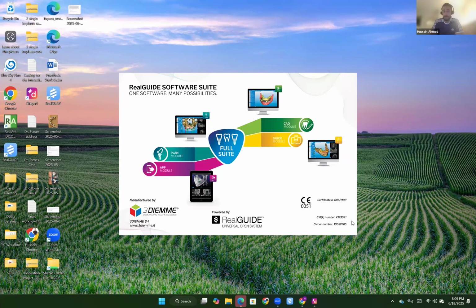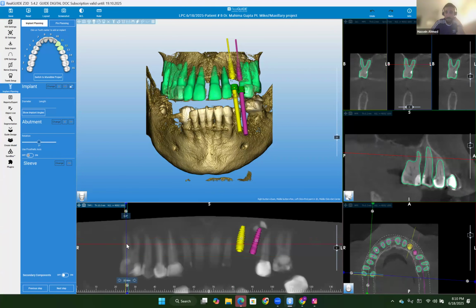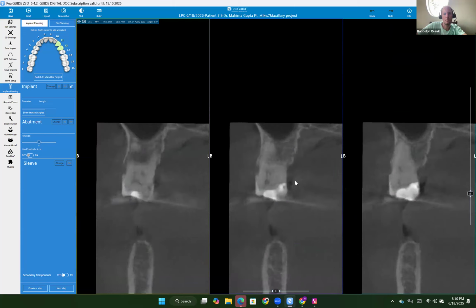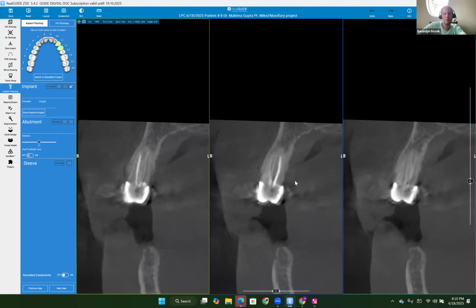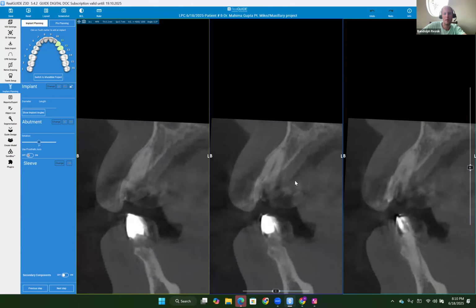So, Dr. Gupta, I planned for like 2 implants for the maxillary arch. I do apologize about that, but I could fix that for you right away. Just go through the cross section, Hussein, and then we'll see. Got it, Doc. Here we go, Dr. Resnik. So I'm going to start with this implant, I'm sorry, tooth site number 3, sir. Yeah, just go through the side. And here we go. So the bone looks pretty good around these teeth, Doc. What's the reason for taking out the upper here?